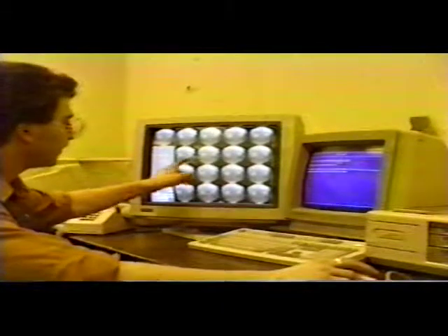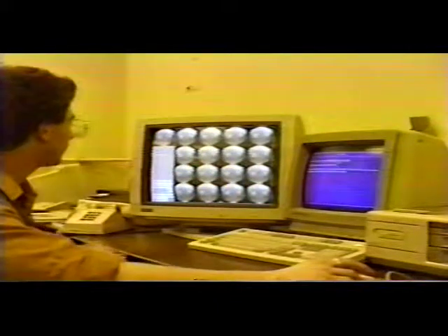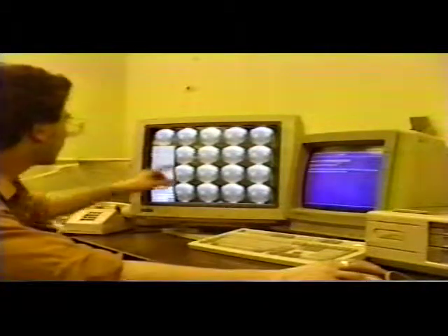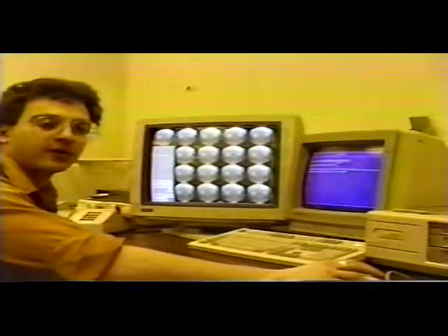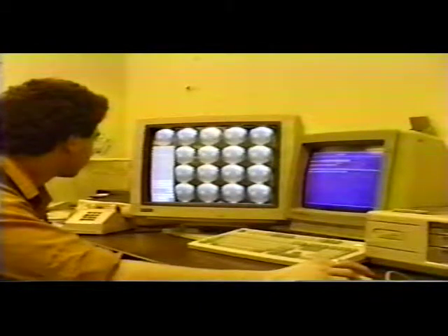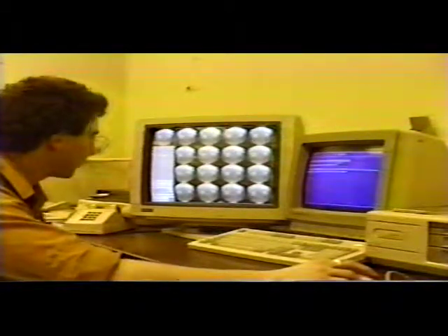Now if you just want to see the range of 8 of these, you can do that by clicking on the range button. Select the first one in the range and the second one in the range. And now when we run it, it's just stepping from 1 to 8. You probably can't even see that. It's not really useful here, but I haven't shown it to you yet.